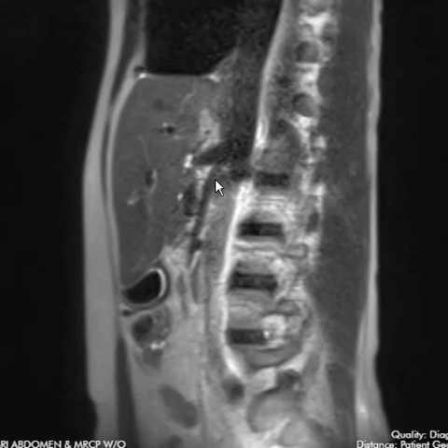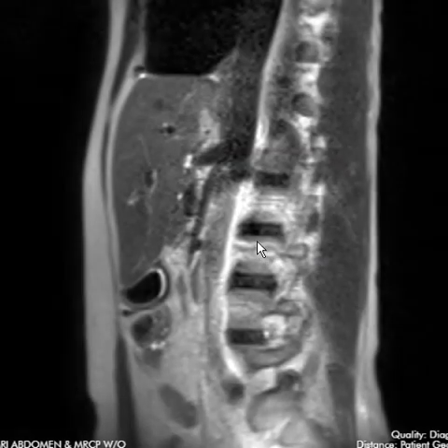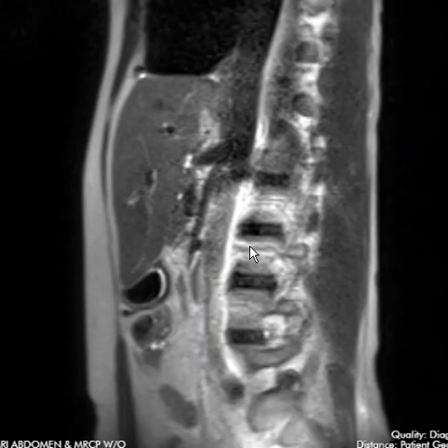And when it's low like that, you can get pinching of the left renal vein as it courses between here. That's called Nutcracker syndrome. And also you can get flattening compression of the duodenal C loop, and that'll cause symptoms just like she has. And this is a tough diagnosis, and a clinical component is super important. You can see this pretty commonly without any symptoms related to it, so it may be a normal finding. But in this case, with her symptoms and the frustration of not being able to figure it out, I believe this may be a case of the SMA syndrome.